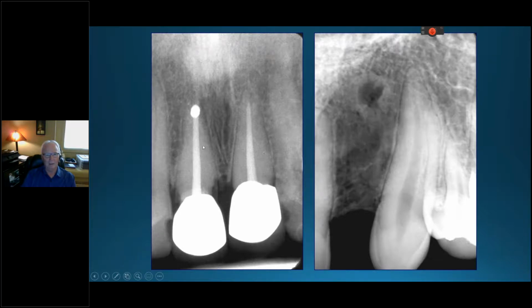So I'm going, oh, they probably had a root canal retrograde, and the thing failed. The scar is from going in and doing the apicoectomy, and it heals in from the edges. You can see the bone coming in from the periphery towards the central region, but because it was a through and through defect from the buccal to the palatal, it never fills in completely. So you have a surgical healing defect or fibrous healing defect, and it would just need watching radiographically to make sure that it wasn't something else.